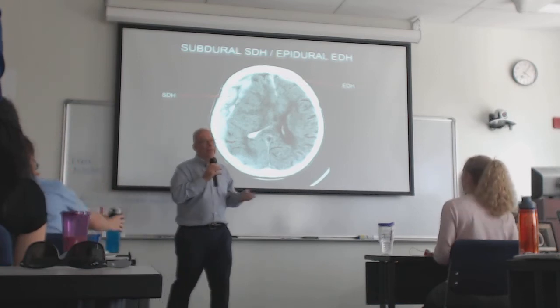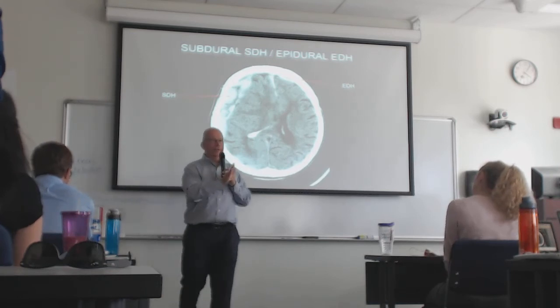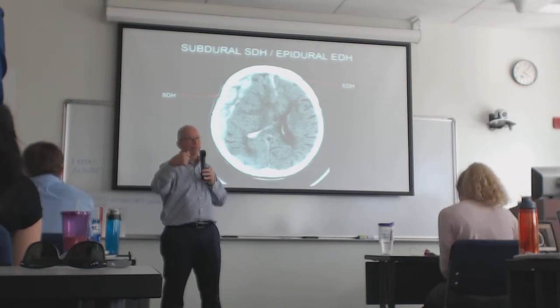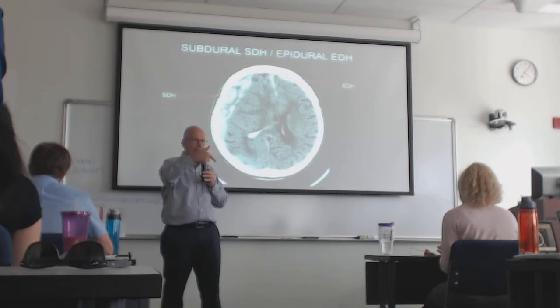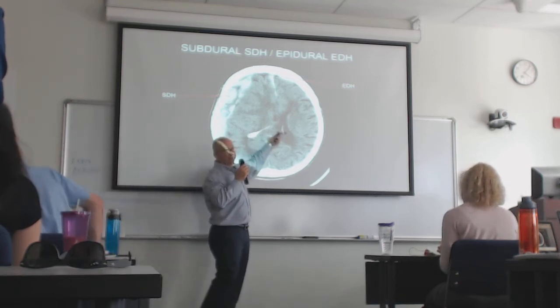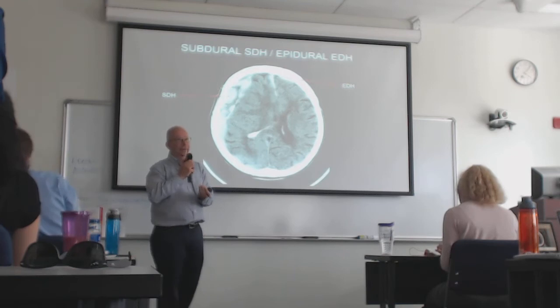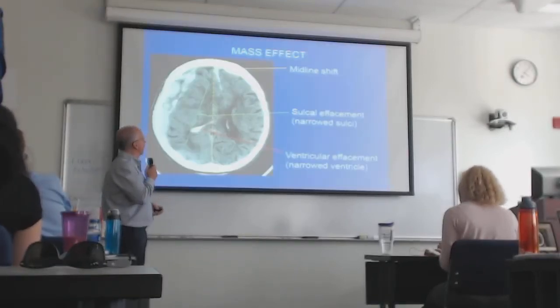The reason why this ventricle is blowing up is because as the mass effect comes under the falx, it basically is pinching off any chance for CSF to flow out of it. But the lining of the ventricle is still making CSF. So it's making more and more, but it has nowhere to go. So it's like it's being pinched. I don't know if that answers your question, but I think I understand it.